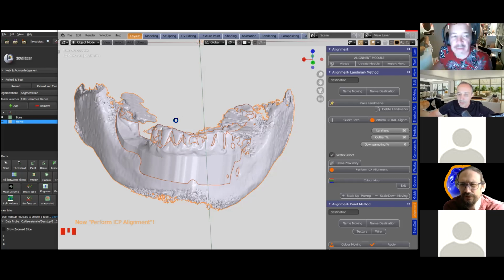Okay. So in fact, this type of function, you only use it with the scan bodies alignment when you really want some very, very geometrical alignment.